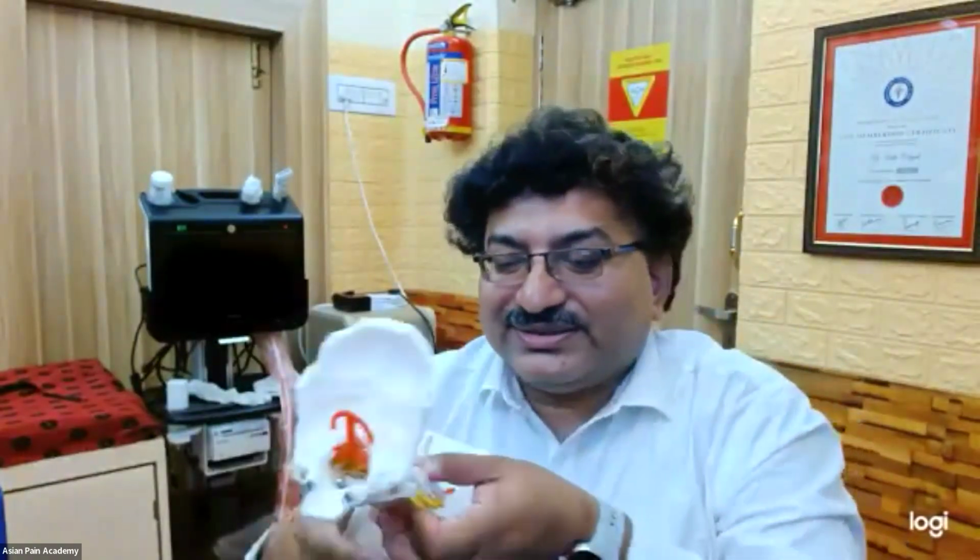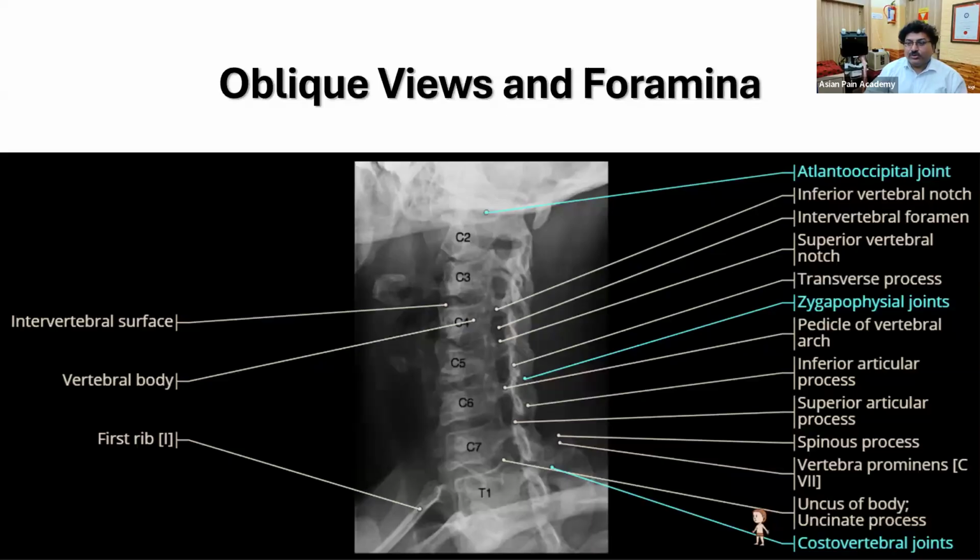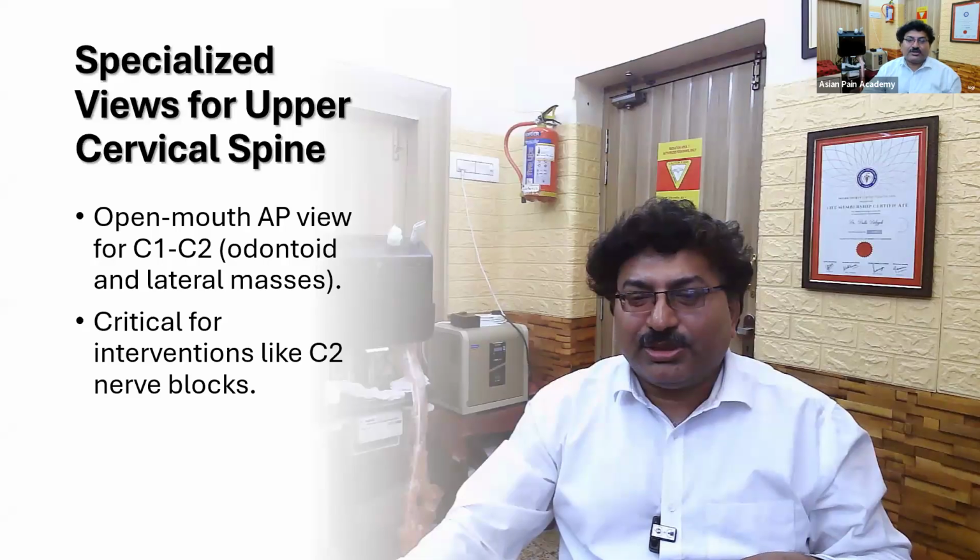When we are looking like this, say for example from this area, it is very difficult to demonstrate. What will happen is that this opposite area will become end on. So it is basically the opposite lamina. With time we will understand, but for now just know it, and next time we will demonstrate under fluoroscopy directly the cervical epidural and show how it becomes end on. A little bit difficult concept, but it is not that difficult either.